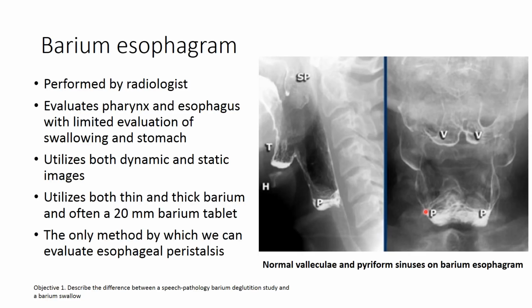And by using both dynamic and static images, the radiologist can observe and evaluate diverticula, areas of stricture, masses or mass effect, or motility disorders.